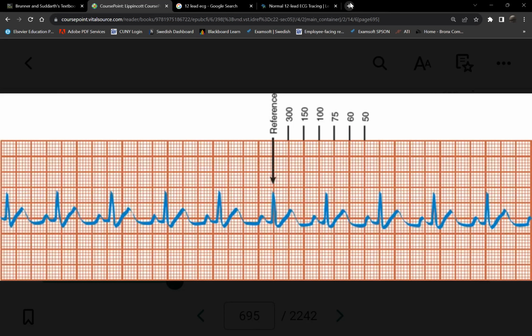No. It's a waste of time. It's not practical. So we only need 6 seconds. Then we multiply that by 10. There's our 1 minute. All of these methods, by the way, are estimates. It can't be accurate because the only accurate heart rate is if you do a 1 minute strip. Then yes, that's accurate because you literally counted a full minute strip. But again, is that practical? You won't have time for anything else.